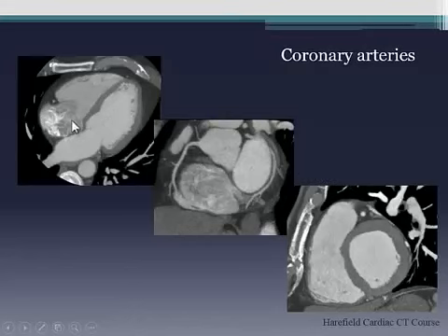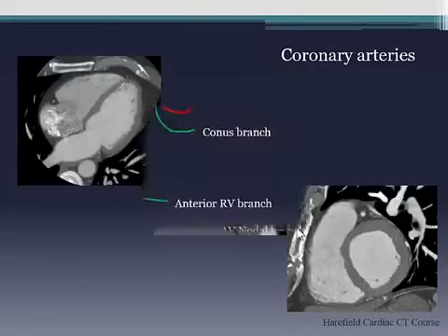Okay, so as you head south now, you get into the interventricular groove, and again, you can see the LAD runs here and the PDA runs there. And remember, here you can see the LAD nicely cushioned around with epicardial fat. Sometimes you'll see it sitting right in the muscle. And this is a really good view if you want to understand bridging. And, you know, for those of you who do angiography, bridging, people say about 3%. It's probably about 30% on CT. We see it all the time. Obviously, the significance is a bit dubious, but anyway, that's another story.